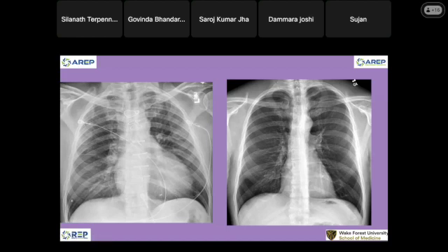Some people will say normal. Heart goes upward a little. Are we talking about this heart? Yes, left. Okay. I show you one more image. This person, a few hours later. Let's look at him.